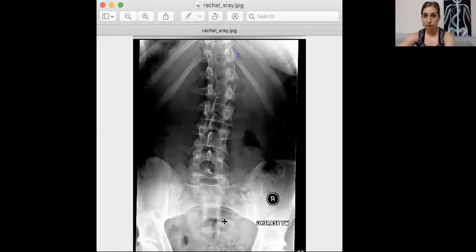Something that you may see, and this happens in adults and in kids, is that some people don't like to follow the rules on the number of vertebrae that typically occur in different parts of the back. The lumbar spine typically has 5 vertebrae. We know that this is my 12th thoracic vertebra, because it's the one with the 12th rib. So if we go, there's lumbar 1, lumbar 2, lumbar 3, lumbar 4, lumbar 5, lumbar 6.